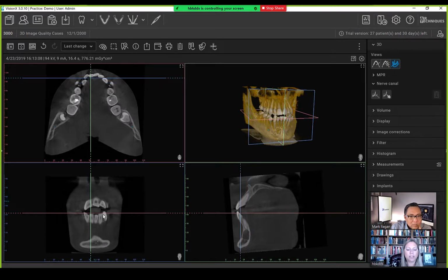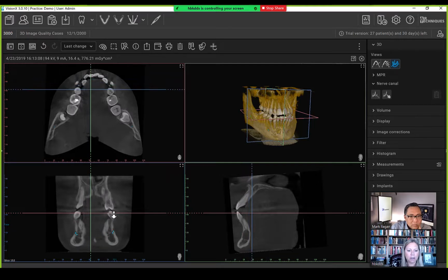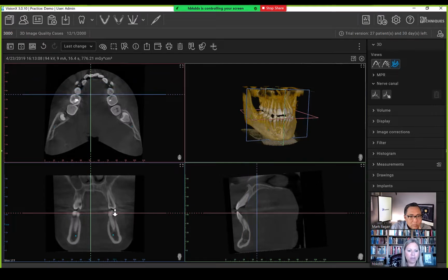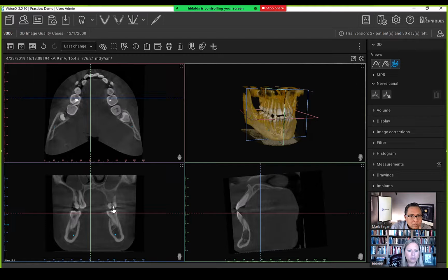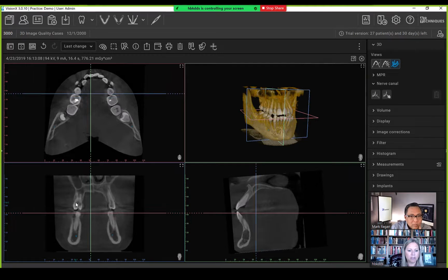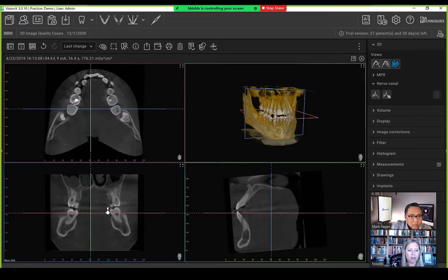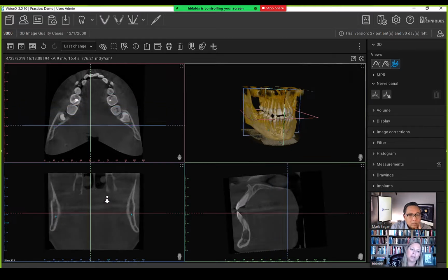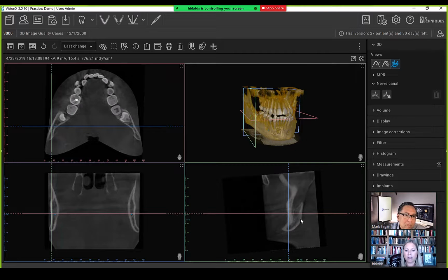And then I'm going to do one pass back, just looking at my maxillary dentition, and making sure that everything looks pretty good from there. Let's see. Oh. Definitely have an issue with this tooth right here as well. See a little periapical lesion there, and all the way back. And so at that point, I'm done with my coronal sections, and I'm going to pick up going through my sagittal. I always pull the crosshairs over to the right-hand side.